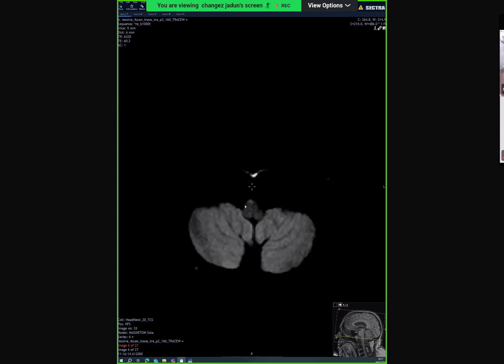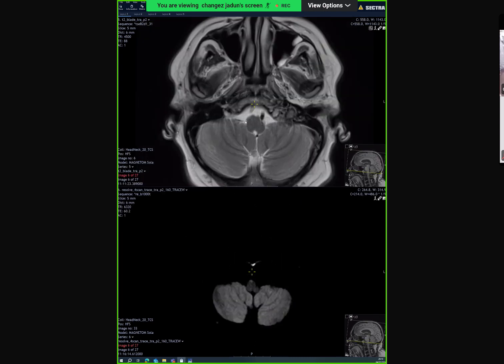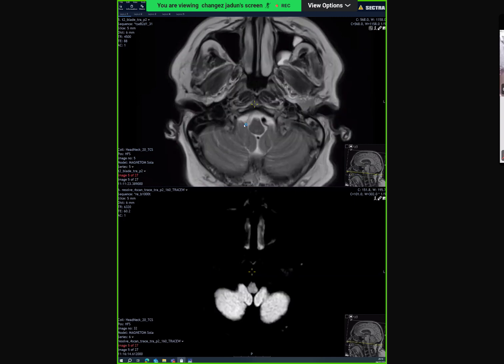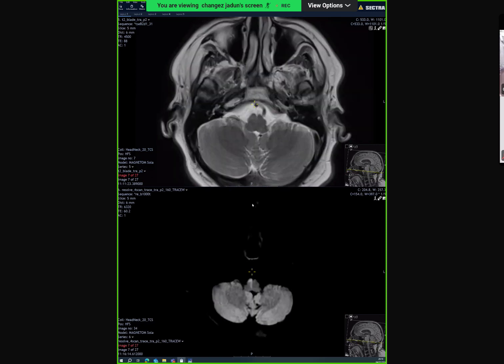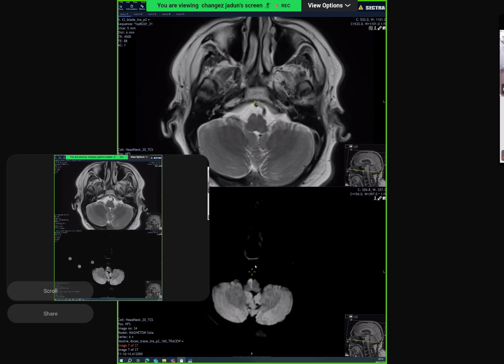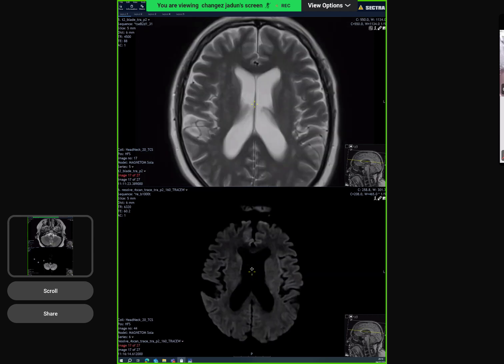So you see absence of signal, even on the normal study of the brain, with such a strong history that we gave you. There is a vertebral artery signal loss, there is diffusion restriction, and that goes in with the vertebral artery perforator infarct involving the medulla. It's a classical picture.